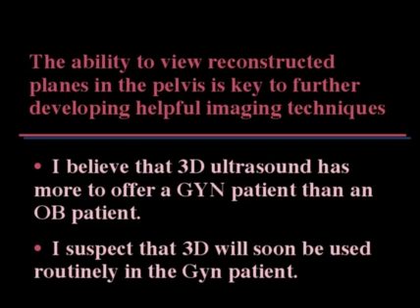So the ability to see the reconstructed planes as in the pelvis is really key to developing these imaging techniques. And I believe that 3D ultrasound has a lot more to offer a GYN patient than an OB patient, and I suspect that 3D will be used routinely in gynecologic patients because we know that it is so much more useful to see the uterus and the adnexa in these reconstructed planes.